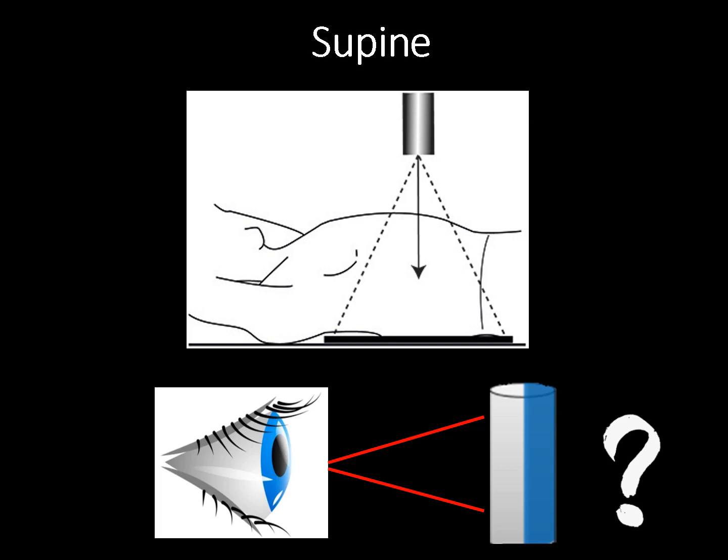If we look at a supine radiograph in contrast, so this patient's laying flat on their back, the X-ray tube is here, we're shining the radiation down, and the detector is behind the patient here. This is flipped up. I want to see what we're actually looking at when we look at the radiograph here. But again, this is analogous to the patient's bowel.